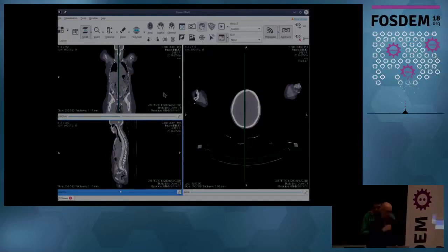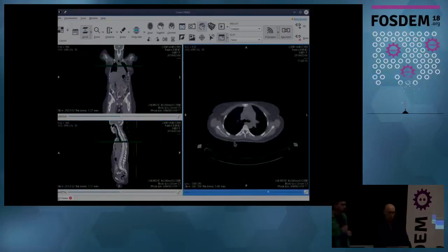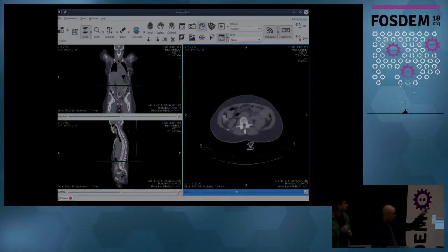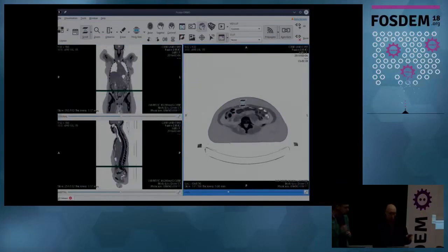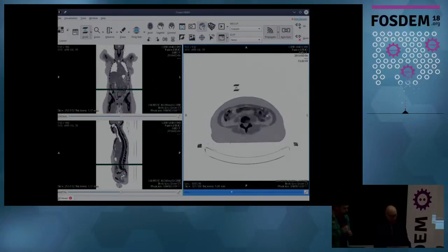Here is the Starviewer main window, and one of the things that radiologists usually do is what's called slicing. Slicing is changing the slice, okay? And as you can see, as I change the slice, this green line moves to show the slice you are seeing right now. I will invert the colors because I think it will ease your task of viewing this. These are called reference lines.